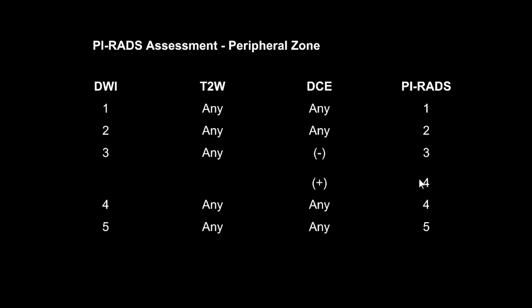So the tweener becomes a 4 based on the DCE MRI and gets biopsied. Early enhancement, before anything else, with or without a washout. On the other hand, if it's non-enhancing, then it's categorized as a 3, or minimally enhancing, it's categorized as a 3, and now you've got a challenging situation.